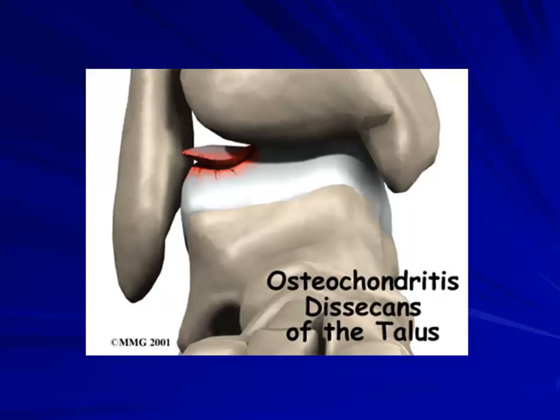The osteochondral defects, these are very common and very sinister. It becomes very difficult at times to diagnose. But painful ankle can be reflective, it can be post-traumatic, or it could be just by minor injury. The most common place is, this is the medial part, that's lateral part, so the superolateral surface is the most common place. That's the cartilage, so you can have cartilage abrasion, then it can take off, just the cartilage can take off the bone, so you have got grading of these OCD.